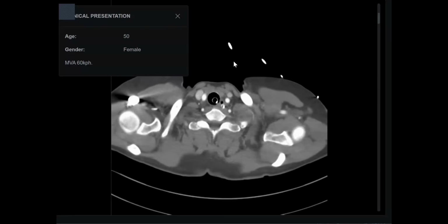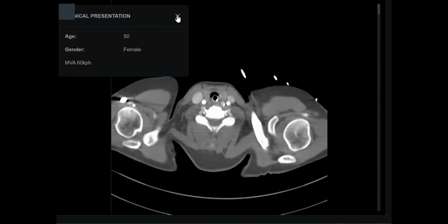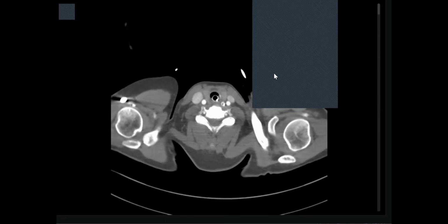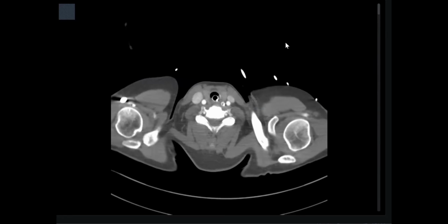Okay, I'll give you this case. Trauma, and we have an abnormality in the chest radiograph. Ask for control. Candidate 7? Okay, I give you the control. You can scroll.